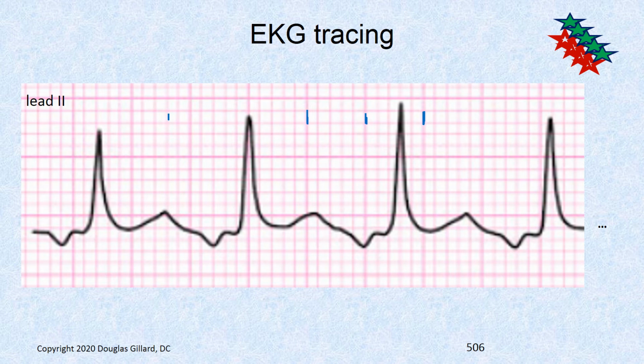Now let's see what else is going on. It looks like the intervals are normal. There's the T wave. How's the P wave? Okay, the same morphology each time. You can look at the P wave to make sure it has the same morphology, so it's coming from the same ectopic foci. There's definitely a PR segment on these. So can this be a junctional tachycardia? No, there would be no PR segment. So this is an EAT, ectopic atrial tachycardia.